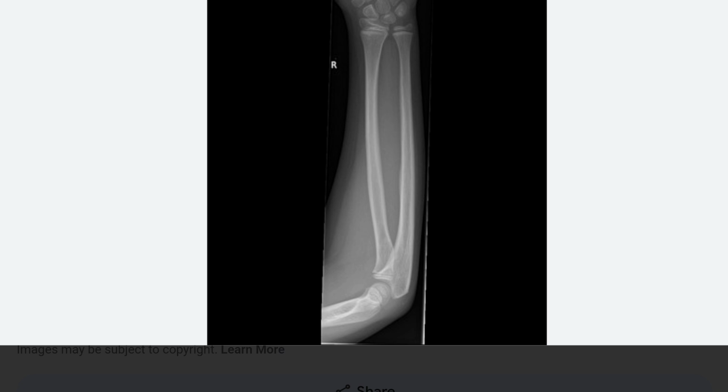There is an intra-articular bony fragment with some calcification speck near radial head, indicative of old injury on AP projection. Lateral projection demonstrates fracture of coronoid process of ulna and some anterior capsular calcification. What is your diagnosis? I will consider this dislocation of elbow keeping in mind the possibility of old unreduced injury that will be ascertained on history taking.